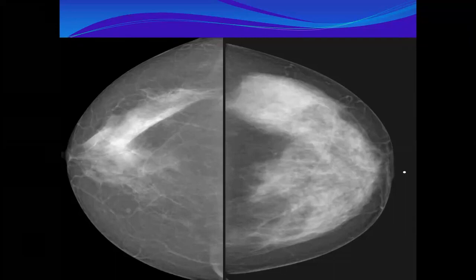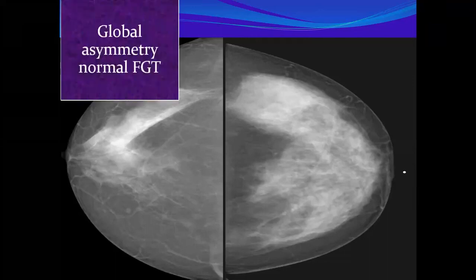Skin thickening. Yes. If I remember, this patient was just screening, and she has no palpable abnormality, and I think it was persisting unchanged since the previous study. So could be normal variant. Normal variant. So it was a normal variant.